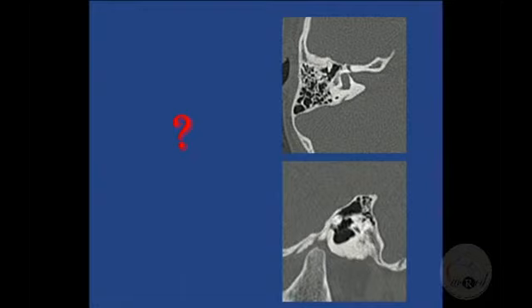Correct. So this is an axial image. That's supposed to be the ice cream cone. You're seeing the ice cream cone is melted off and it is attached to the anterior wall. And on the sagittal image, it is attached to the anterior wall here and the superior wall here, which is the tegmen tympani. And also, I mentioned that the manubrium and the long process of the incus should be parallel. You're not seeing that configuration. So your molar tooth is absent on the sagittal image. Your ice cream cone is not okay. So that's an abnormal ossicular chain. So that's normal for your comparison. Ice cream cone and a molar tooth, that's both missing, right?